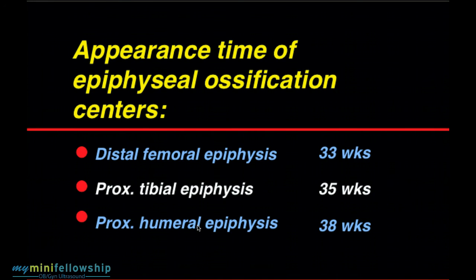So you can say, I see it, I look at it, and I see that the fetus is measuring around 35 weeks. So it gives you a check that the measurements seem appropriate for that particular fetus. Now, if the proximal tibial epiphysis actually has a wider width than the distal femoral epiphysis, then again, you may reasonably assume that the fetus is at or near term.